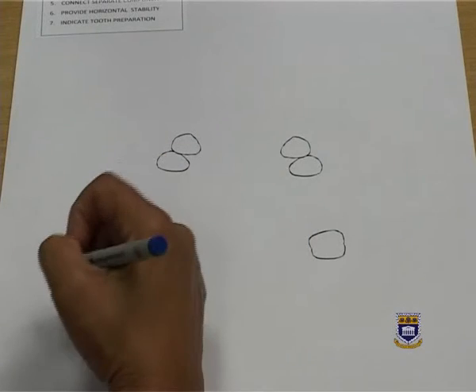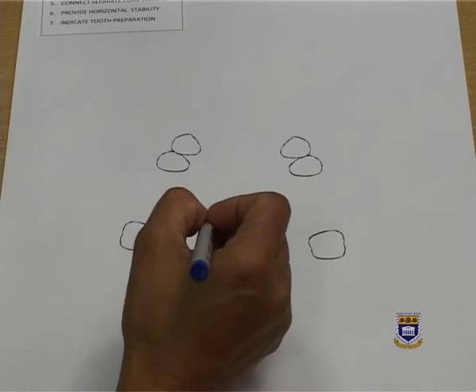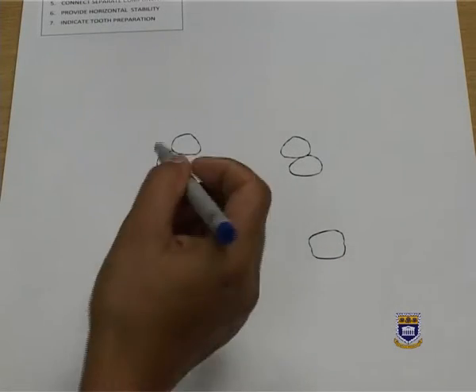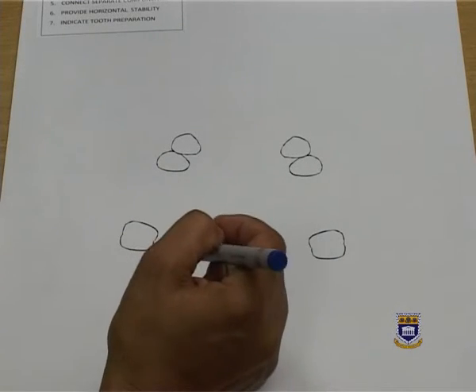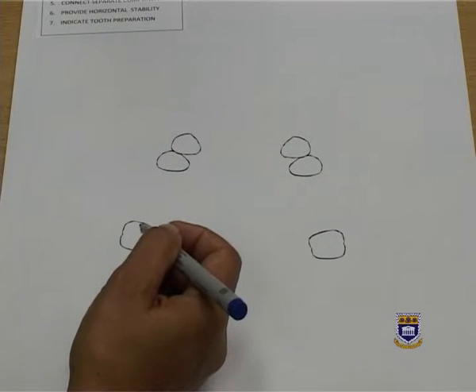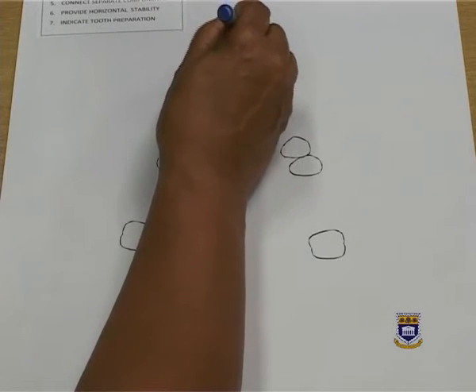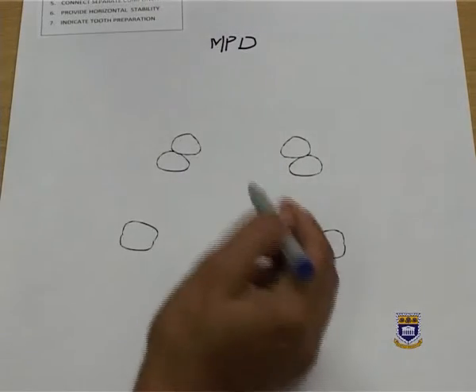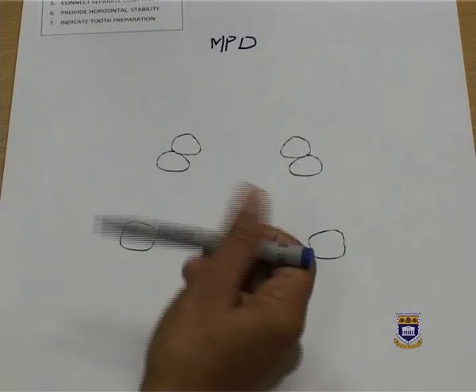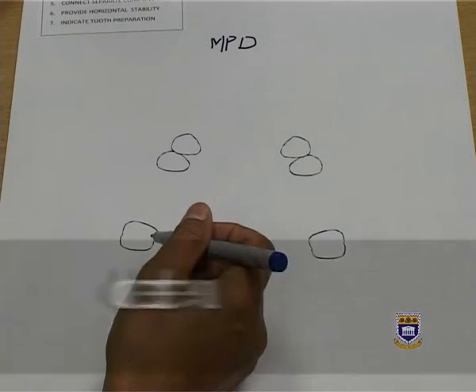We will continue with our designing and construction of removable partial dentures, and I will be going through some different designs, some different classifications, and also various options for clasps, etc. that we can use. I will be designing a metal partial denture again. This will be a Class 3 Modification 2 again.